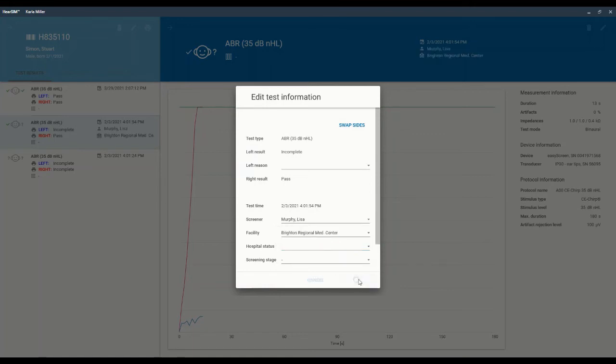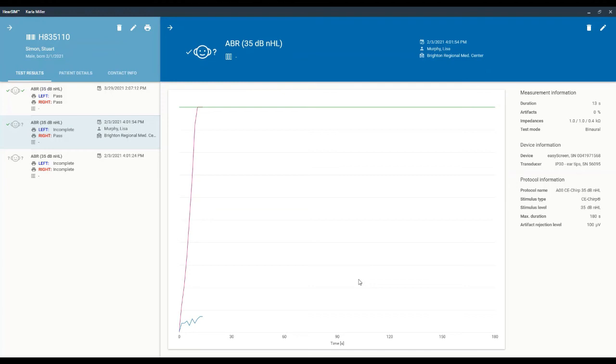If you attempt to make edits but do not have the edit icons I've shown in this video, this means that you've been set up in the Database Administration program as a user type that does not have permission for editing data. Speak to your program administrator.